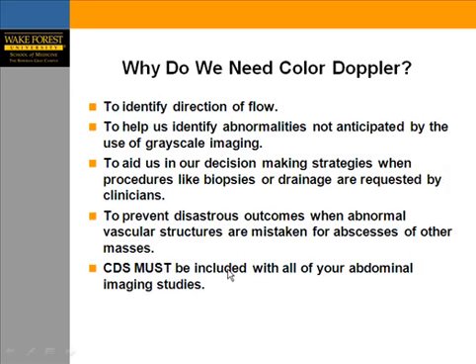Now, why do we need color Doppler? This is a question we all ask ourselves. Basically, to identify the direction of flow, to help us identify abnormalities not anticipated by the use of grayscale imaging, and also to aid us in our decision-making strategies when procedures like biopsies or drainages are requested by clinicians. The other important point is you need to prevent disastrous outcomes when abnormal vascular structures are mistaken for abscesses or other masses. Color Doppler sonography must be included with all of your abdominal imaging studies.